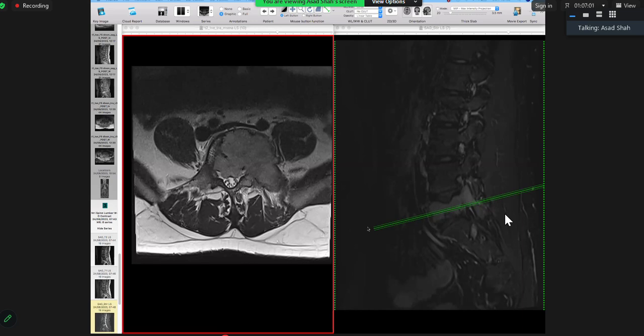It involves a tumor. And if I had said this is a 60-year-old, you would have said metastasis, myeloma, lymphoma, isn't it? All of you. I mean, myeloma probably is like a plasmacytoma if it's the only single lesion there, right? But when it's 40 or less, then it's a giant cell tumor.